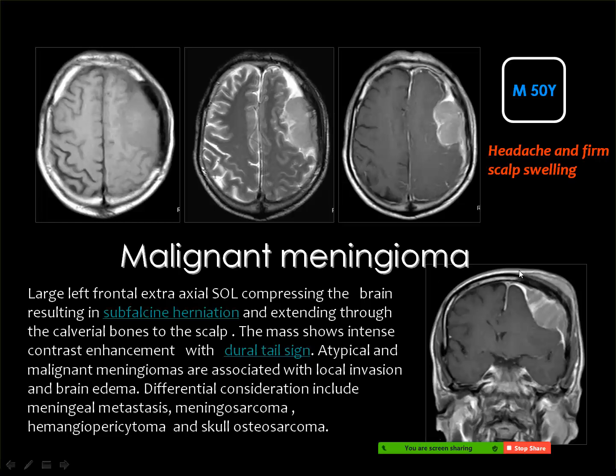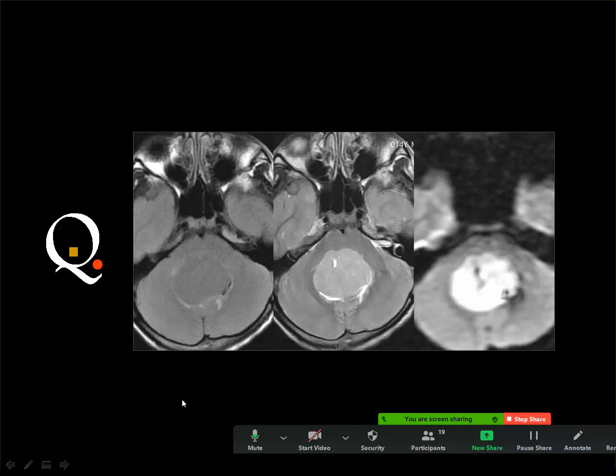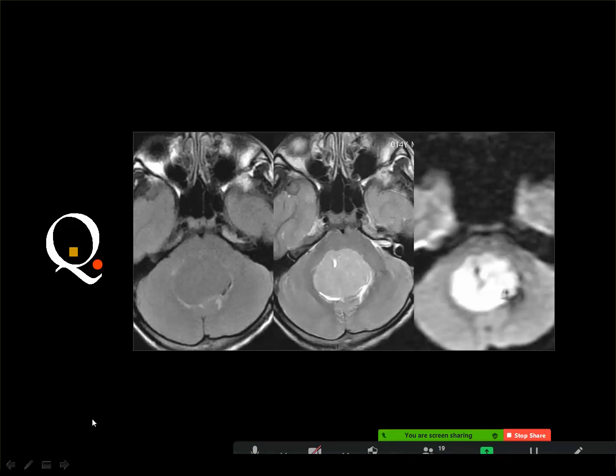And this term is an old one, which indicates a malignant meningioma. It's no more used, but the term atypical meningioma or meningioma grade 2 or grade 3 is usually the preferred term nowadays. It is enough for you to say that this is an atypical meningioma or even to say hemangiopericytoma is good, but whenever you are asked about the differential diagnosis, you should say lymphoma and metastasis.